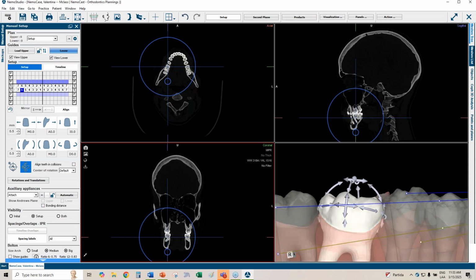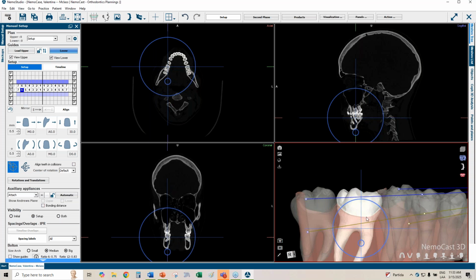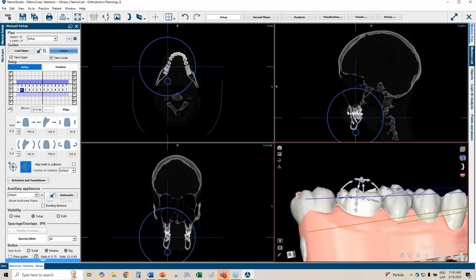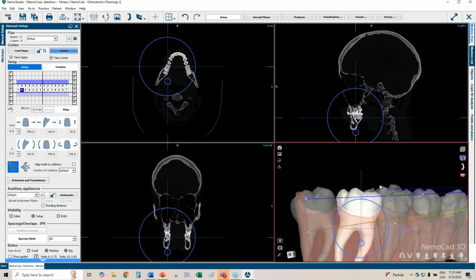But we can also use the blue tracker right here to perform linear movements, so a combination of X and Y axis, and rotation, but the center of the crosshair is the pivot point for the rotations. Whereas when we're working with the green tracker, the pivot of rotations is going to be the center of the clinical crown. So those are the two uses that we can get.